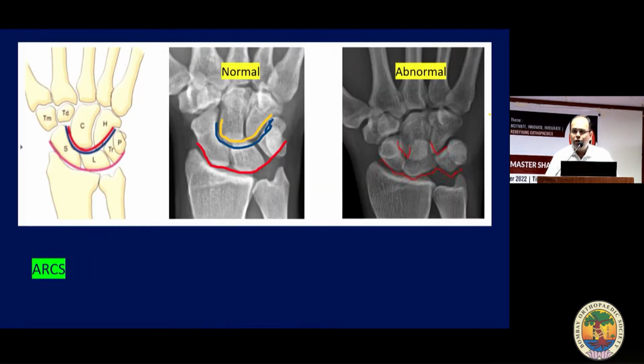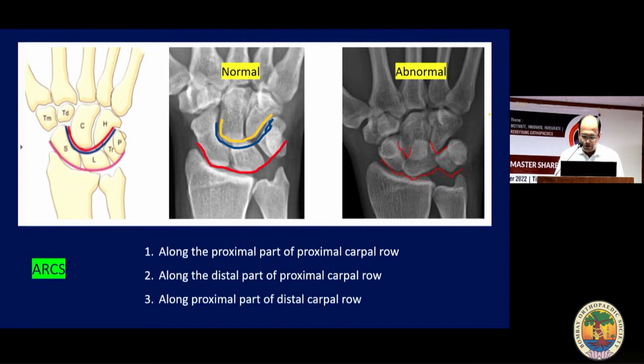So what do we mean by arc? An arc means a line drawn along the proximal part of the proximal carpal row. That is one line. The second line is drawn along the distal part of the proximal carpal row, and the third line is along the proximal part of the distal carpal row. If you see any disturbance in these lines, that means there is a problem in the carpus. So these are the three lines that we see.